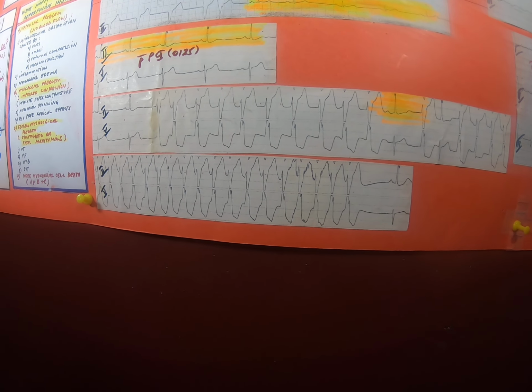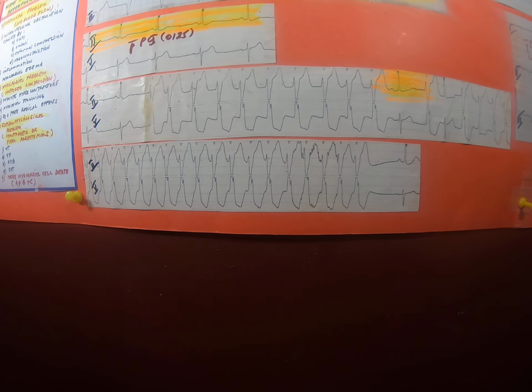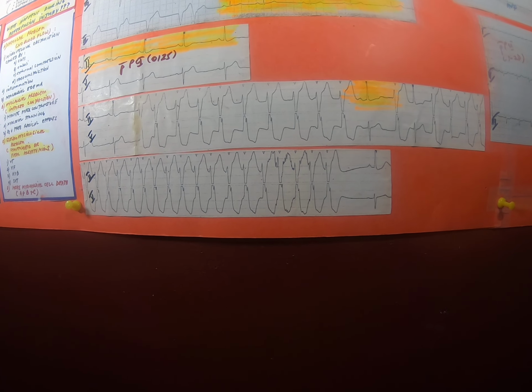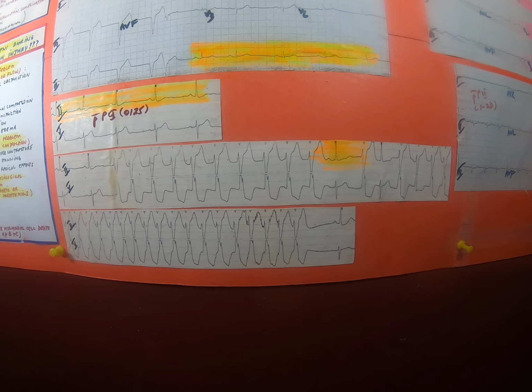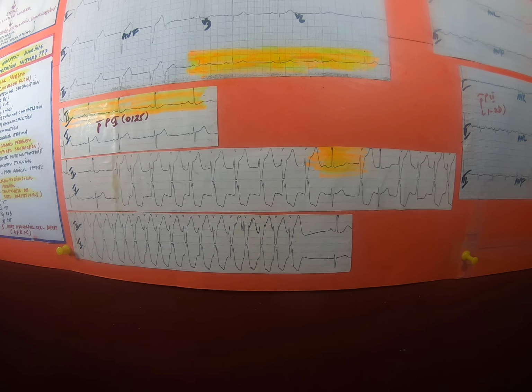Now, the reperfusion rhythm here, from slow VTAC to VTAC, is actually caused by automaticity. So all you have to do is check that the lytes are okay, the patient's lungs are clear, they're not in failure, and they're not blocking their stents. So, continuous assessment of the patient.